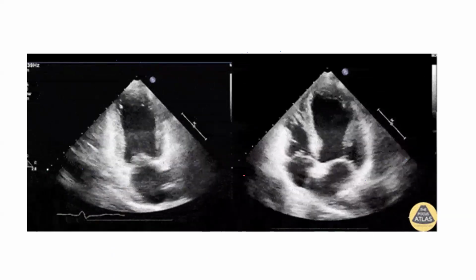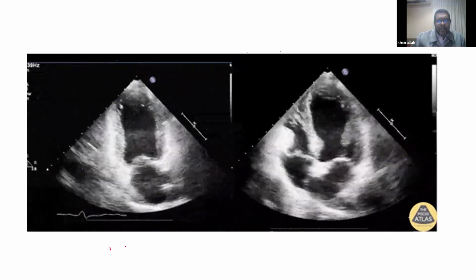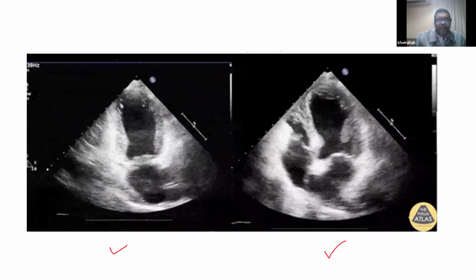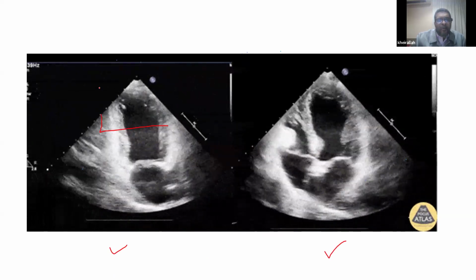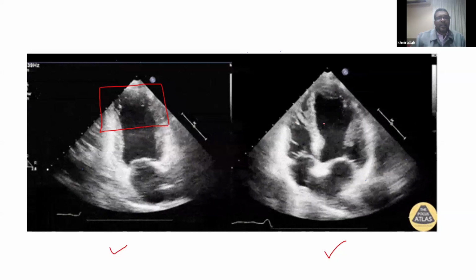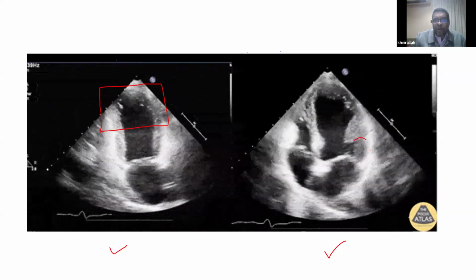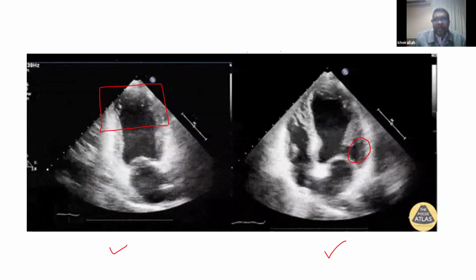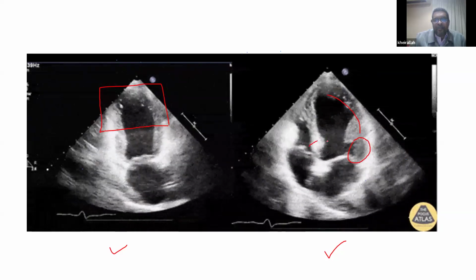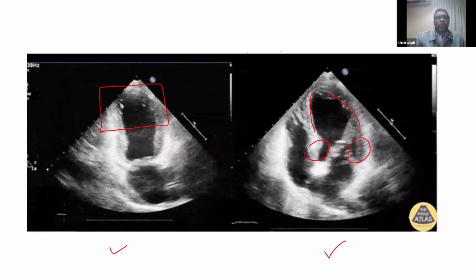This is a bit strange. You say this is apical 2 and this is apical 4. What we are seeing here is from mid segment downward, we have no contractility, i.e. akinesis. Again here, this is the basal lateral wall. It's contracting, but the mid and apical part is not. Here, the inferior septum base is contracting, but the mid and downward is not.